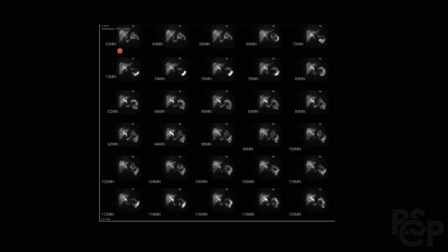This is another example, and what we're looking for here is the gallbladder and the increased radiotracer uptake in the gallbladder working its way downward to the small bowel. This is at 62 minutes, so the patient received morphine at the 60-minute mark after the gallbladder was not visualized, and an additional 60 minutes of imaging was conducted. Again, what we're looking for is the gallbladder, which we don't see work its way downwards all the way to the 120-minute mark, and there are still no signs of the gallbladder. So this would be indicative of acute cholecystitis because it meets our criteria: the patient received morphine at the 60-minute mark after the gallbladder was not visualized, an additional 60 minutes of imaging was conducted, and there are still no signs of the gallbladder.